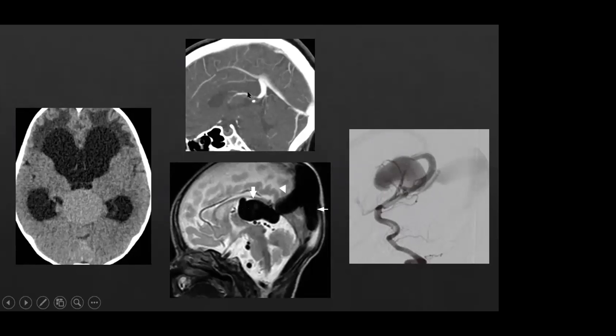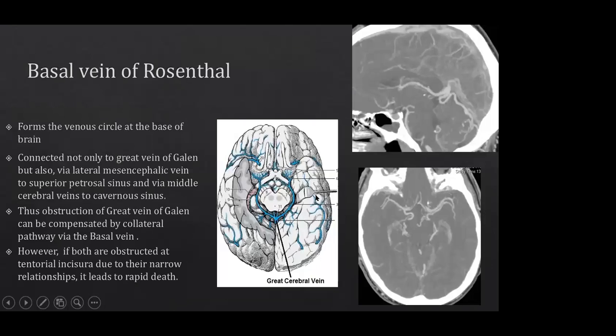This is the normal anatomy, the internal cerebral vein, the vein of Galen, the straight sinus, and here you can see the vein of Galen is dilated because of the fistula. And the other thing to note is that a normal straight sinus is absent in some of these patients, and they get this unusual sinus called a falcine sinus, which is between the falx cerebri, which is in that direction in the midline, and the straight sinus can be absent, as you can see.